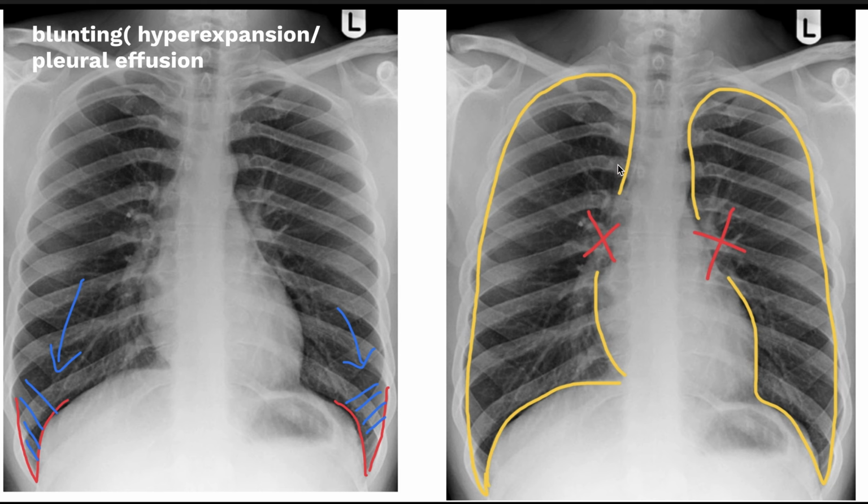Now, the pleural space is important. Usually, the pleural space, you know, the pleural cavity of the lung. There's a visceral pleura and there's a parietal pleura. The visceral pleura covers the lung, whereas the parietal is more towards the edge. Now, usually this area is very important because the pleural space is an area where there can be tension pneumothorax. Tension pneumothorax is when there's air in between the pleural cavity. If there's fluid, then it's known as a pleural effusion. If there's any sort of pus, it's known as an empyema.